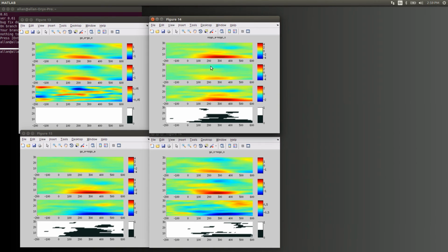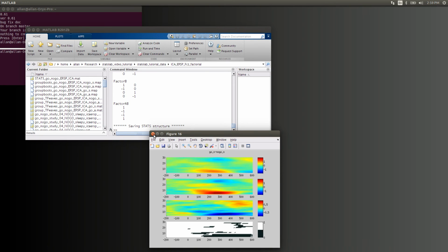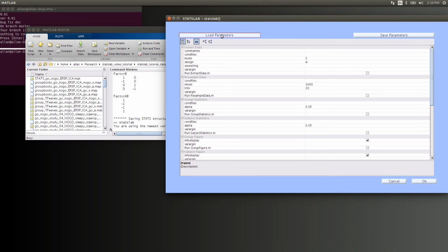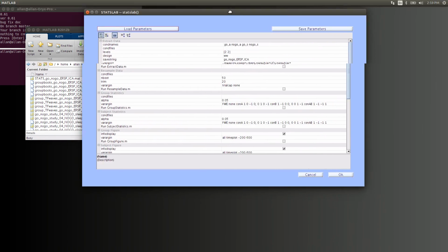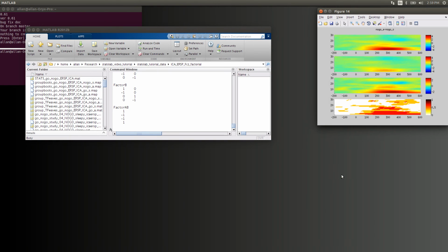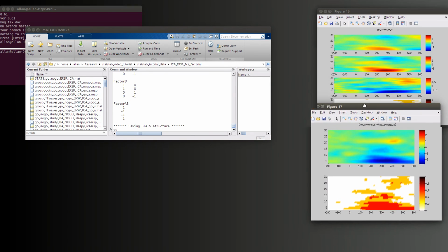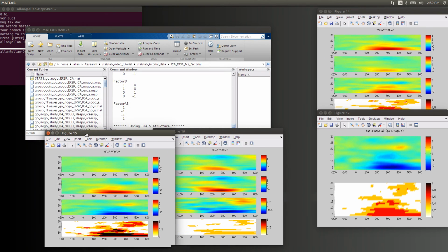Now we're almost done. The last thing to do is to do the spectral plots, but at the single subject level. So let me load the parameters again. I think this is it. We'll go down to subject figure, and now we'll plot a subject figure, and we'll see what that looks like. Okay. Good.